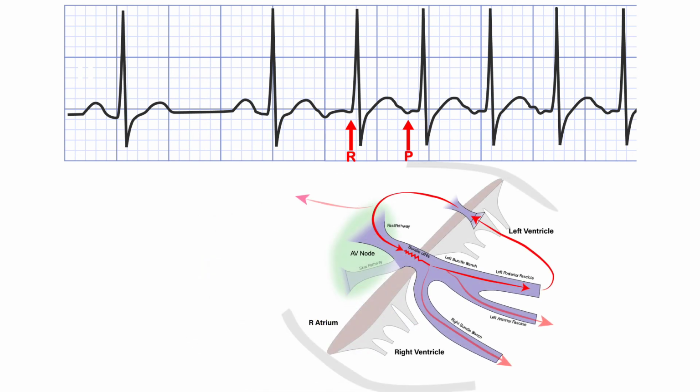In the case of AV-RT, this could be AV-RT. However, when the ventricle is activated, there's a long delay before the next P wave is formed. So if this pathway is decremental or very slowly conducting such that it creates a very long VA time, it is possible. So AV-RT with a decremental retrograde accessory pathway is a possibility.